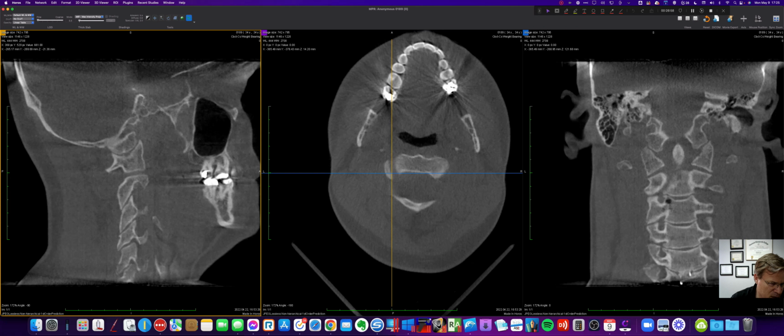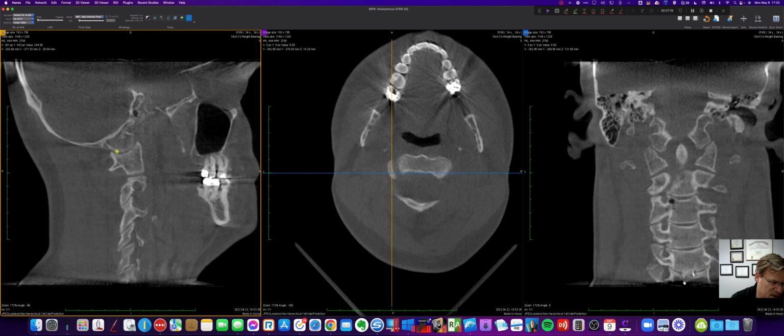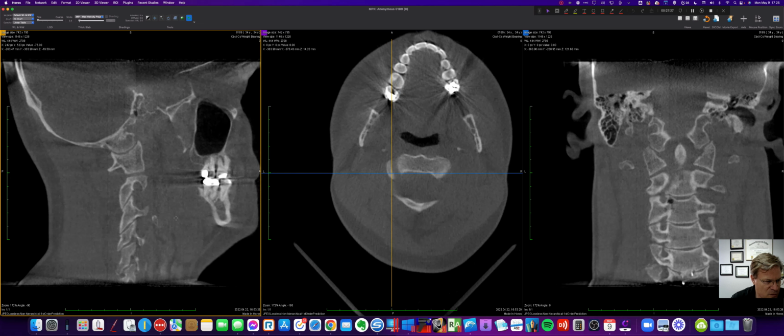Even looks like there's possibly that might be finished there, but this, not the best place to look, is a good secondary place to look. That looks anterior, or lined up if that's an osteophyte. It doesn't really look posterior, but that would give me pause, and it does look like things kind of end right there on the lower one, and then we've got some extra bone going anterior. So that's probably a false positive for a PRI.